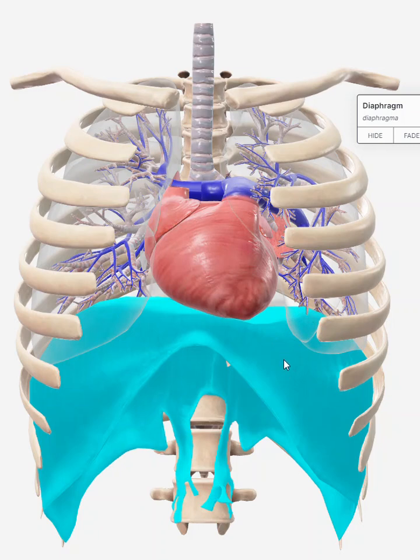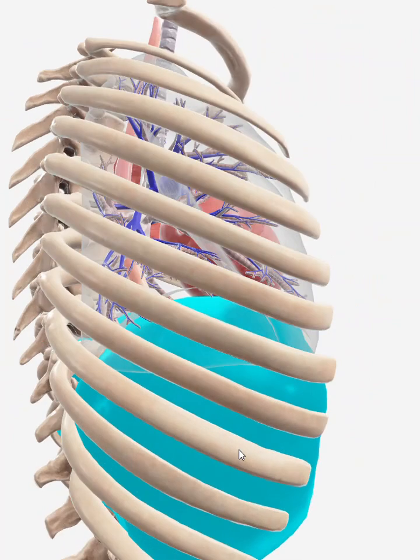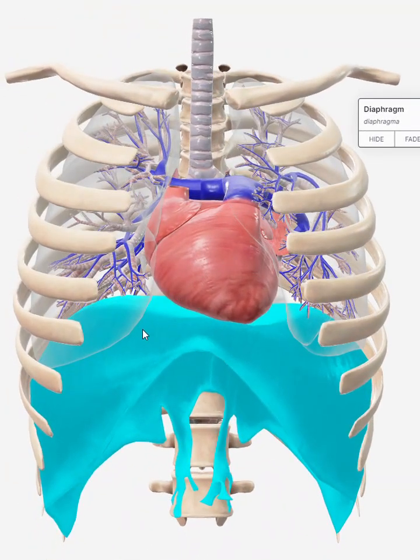Okay, so I hope this was helpful for the criteria, looking for those anatomical structures, and just remembering that we're looking at structures that are kind of pancaked together on our image. So we've got the heart pancaked into the pulmonary vessels, the trachea, the esophagus, then we've got the vena cava, we've got the aorta. There's a lot of things that I've taken off of this image to show you the things that we're looking for specifically on the chest x-ray itself.